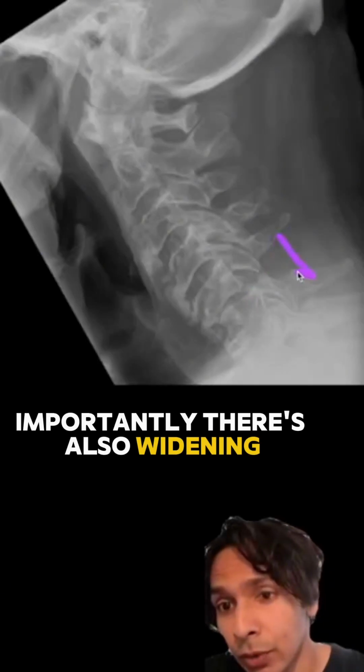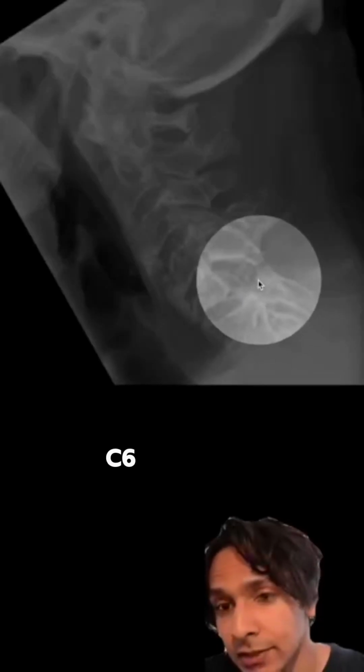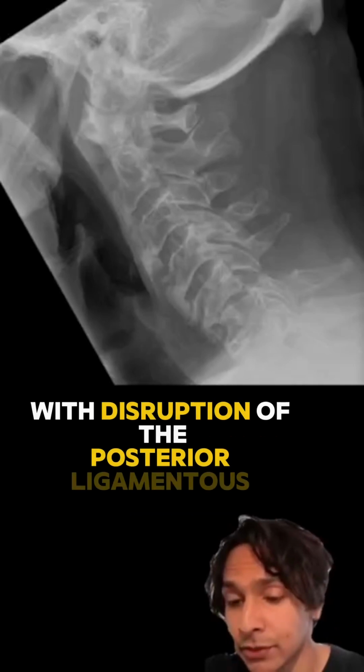Importantly, there's also widening of this interspinous distance here. So when we have a look at the facet joint, we can see that the C5 facet is perched on top of the C6 facet. So this is a case of a perched or a subluxed facet joint. This is an unstable injury with disruption of the posterior ligamentous complex.